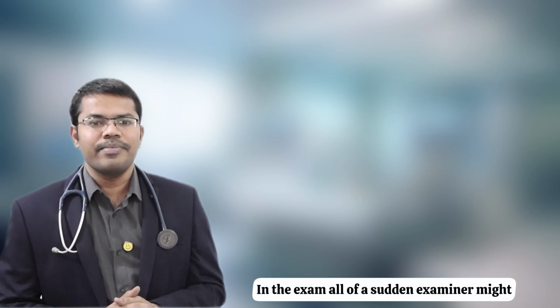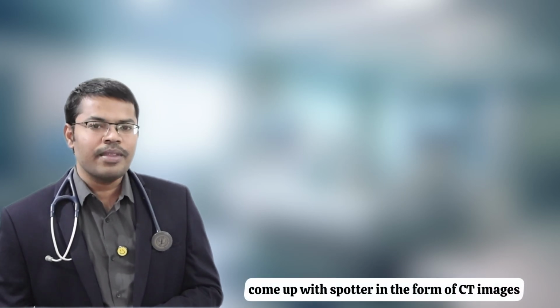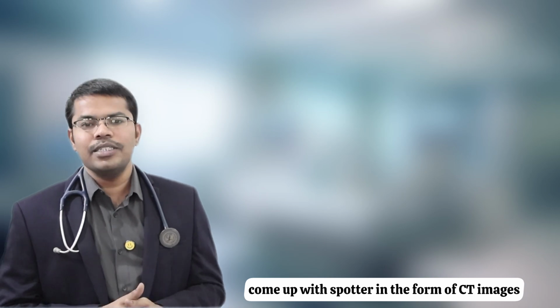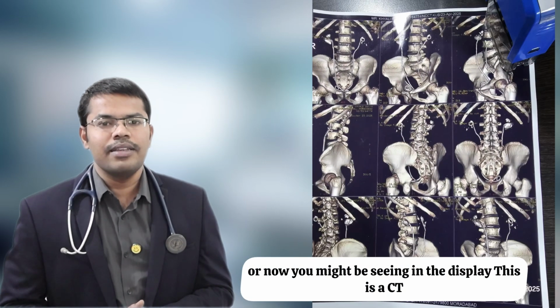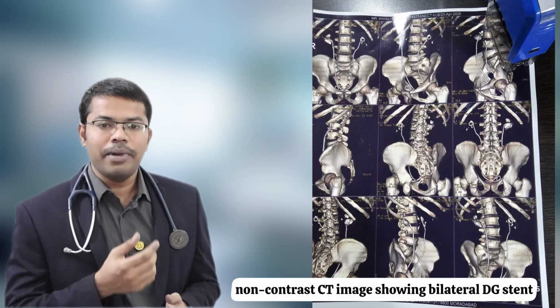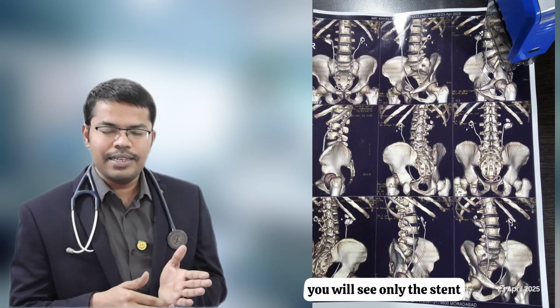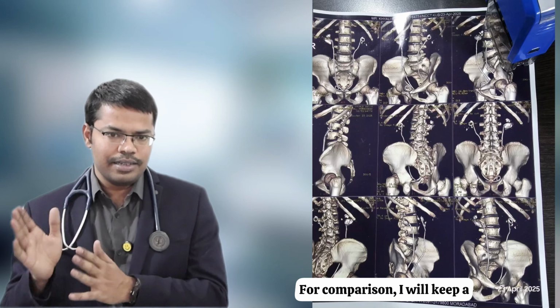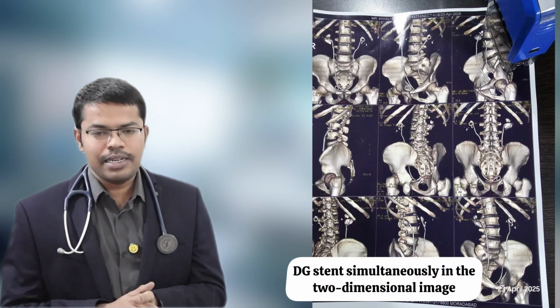In the exam, all of a sudden, examiner might come up with a spotter in the form of CT images only, but those are 3D reconstructed VR images as shown either in the background or now you might be seeing in the display. This is a non-contrast CT image showing bilateral DJ stent. In the two-dimensional image, we will see only the stent. For comparison, I will keep a DJ stent simultaneously in the two-dimensional image.